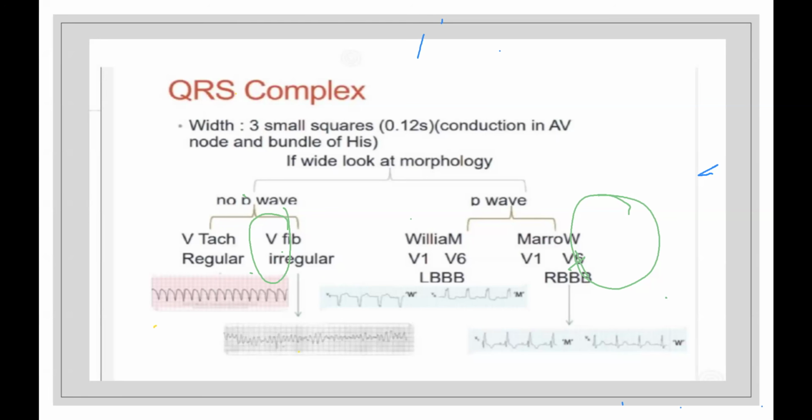पहले किसमें पी वेव देखने का मैंने बताया था? जब रिदम का प्रॉब्लम था, मैंने कहा था जैसे ही रिदम इरेगुलर लग रही है, पहले पी वेव ढूंढो. पी वेव है, साइनस एरिथमिया. पी वेव नहीं है, problem start. So similarly, if you have wide QRS complex and if you do not have P wave, that means origin is from the ventricle. So ventricular origin अगर हो, तो 2 ही जो है वो प्रॉब्लम्स होते हैं, या तो वेंट्रिकुलर फिब्रिलेशन होती है, या फिर वेंट्रिकुलर टैकीकार्डिया होता है. ठीक है, सो ये आपको वेंट्रिकुलर फिब, वी फिब और वी टैक, इसमें आपको ब्रॉड कॉम्प्लेक्स टैकीकार्डिया मिलेगा.